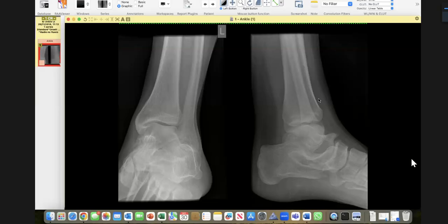Okay, I think there is a technical issue. So please describe whatever you are saying. I cannot see your mouse. Okay, sir. There is a bony projection that is arising from the calcaneum and it is joining with the adjacent talar bone. So, where is the talar bone and where is the bony projection? Can you see my mouse or not? Yes, sir, I can see your mouse.